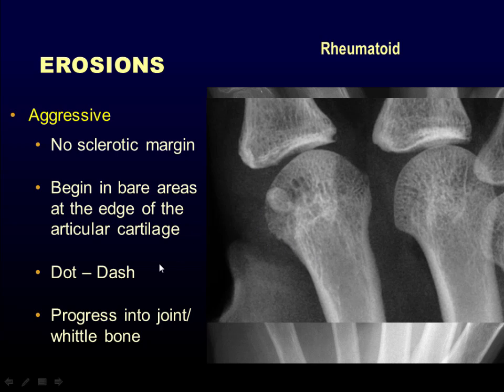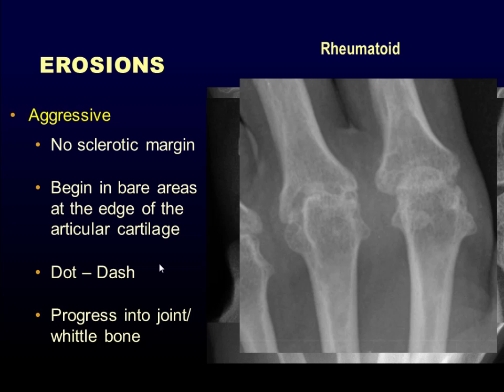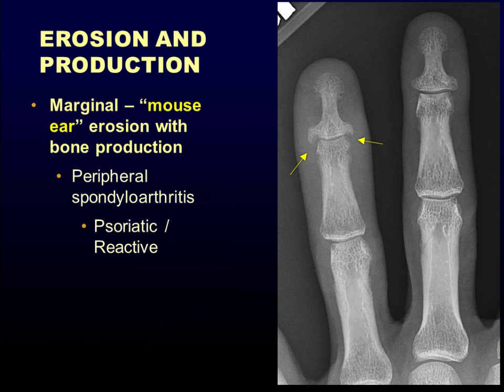and it's because it's early erosive changes. As the cartilage is completely removed from the joint surfaces, the joint margins settle together, and the erosions may begin to appear on the central portions of the joint. All of these are in patients with rheumatoid arthritis, and you'll notice that none of them have much in the way of secondary osteoarthritis formation. Some erosions naturally produce bone.